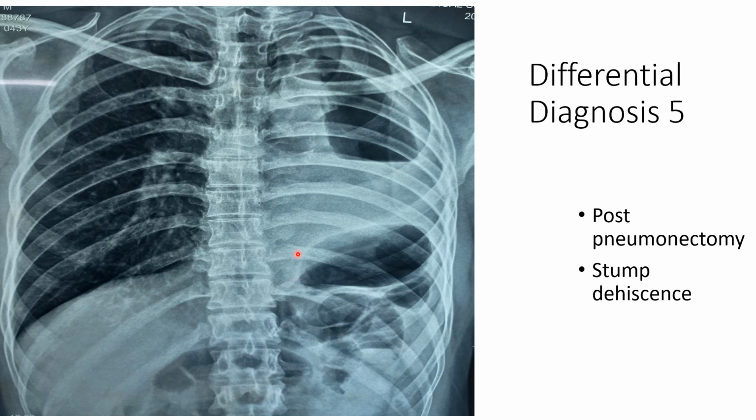So this is the diaphragm, and this gut and this fundal shadow are here. So this is the diaphragm origin. So here you have air above, and this is a fluid. I'll tell you the case. This is a post-pneumonectomy case. So what has happened is, in the post-pneumonectomy space, usually after surgery, a serous fluid fills the space gradually. So the entire empty space after removing the lung will be filled with fluid.